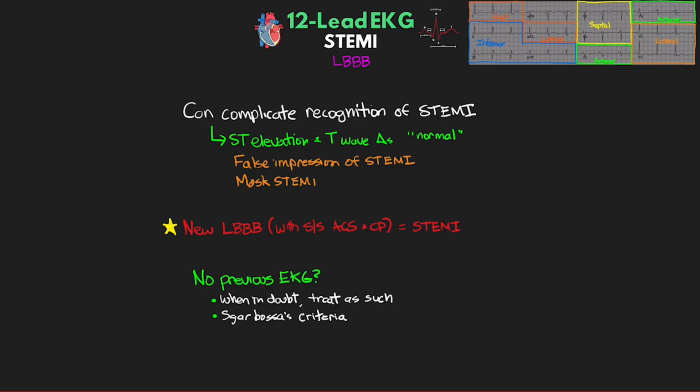Alright, well, we covered a lot of information in this lesson, and this was a lot of really important information, as being able to identify acute myocardial infarction on EKG is probably one of the most important things to be able to do.